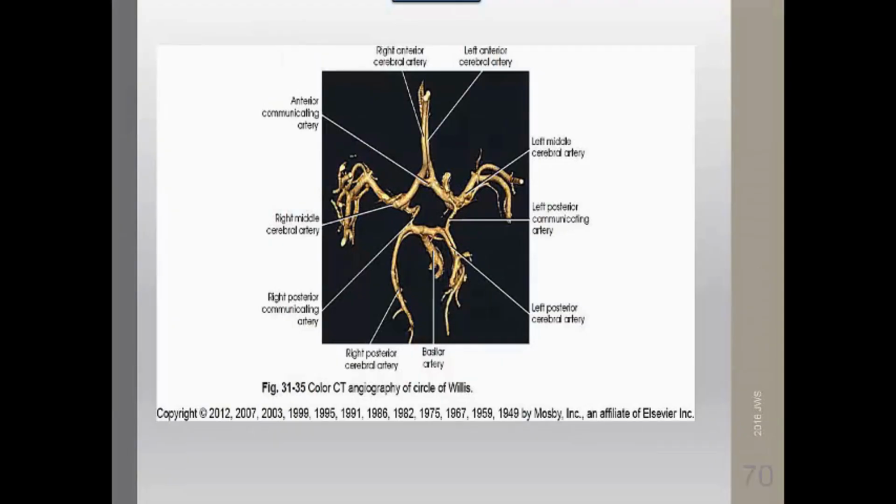This image is a 3D reconstruction of the circle of Willis from a superior point of view. And what you're going to do when you've made this 3D image is rotate that in 15 to 30 degree increments. You'll go anterior to posterior, left to right, inferior to superior, just so the radiologist sees that circle of Willis in all angles, all different perspectives.